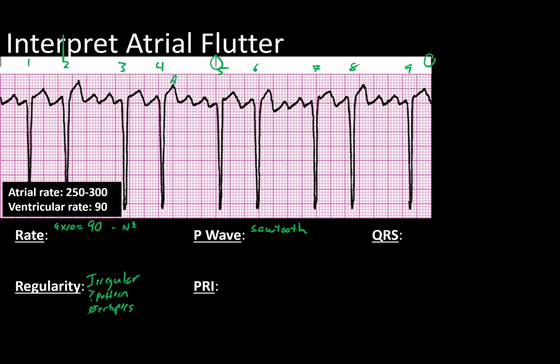So we'll label that A, and this one B, and this one C. And so if we follow that undulation, we'll see that there is a D here, and then we have A, B, and A, B, C, D, A, B, A, etc., etc. So we actually have a 2-to-1 and a 4-to-1 block going on in this case, and it's repeating back and forth.